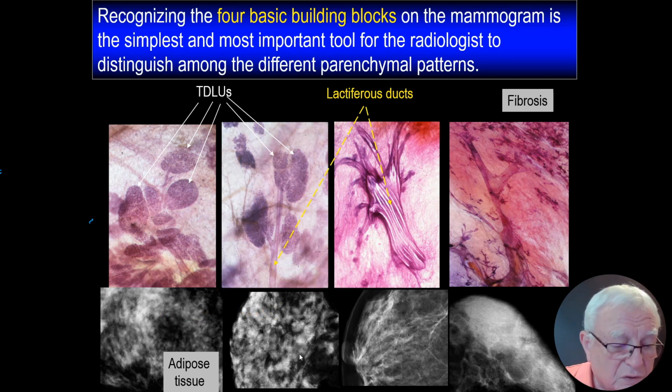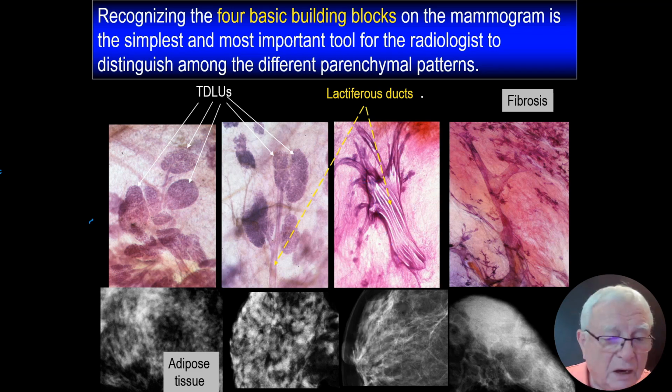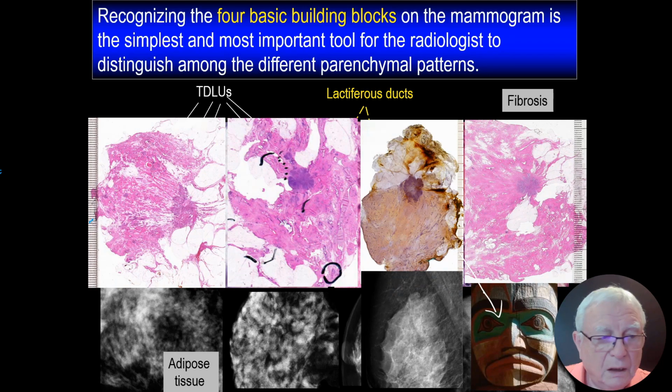Let's go back to the basics. We talked about 1 and we talked about 2, and here is basic building block number 3. Its reflection is going to be this one. Linear density and fat and linear density and fat. Wonderful. That's going to be the duct. Suddenly, you understand, I understand most of 3 out of the 4 basic building blocks. Trouble is around the corner. And then your face and my face looks like this. It's called fibrosis. It's called mesenchyme. It's called fibrous connective tissue.